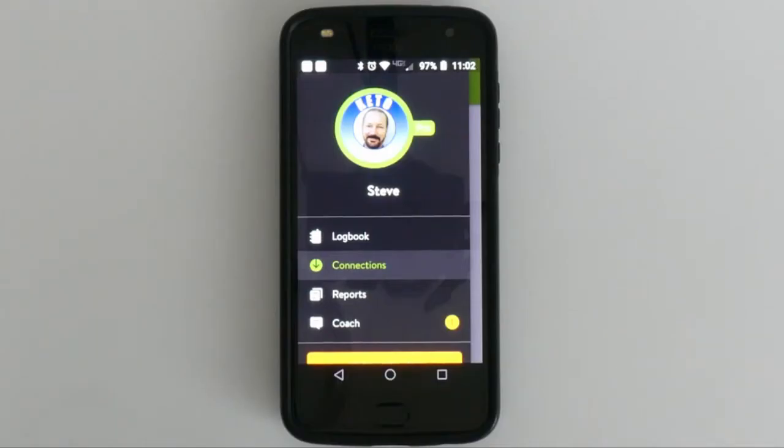This is the home screen of the MySugr app. You can upload your own photo, which I've done obviously, and I paid for the Pro version, which is $24 a year. What that allows you to do is download the files that show your progress and your stats for each week. So I use that to give to my doctor, my endocrinologist. If you don't need to do that, you can save yourself 24 bucks. It's a free app.